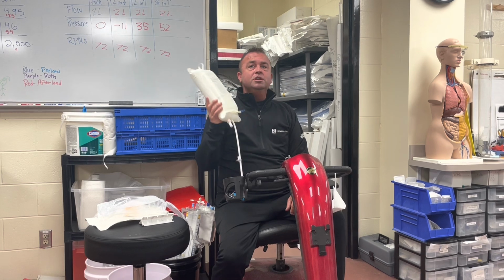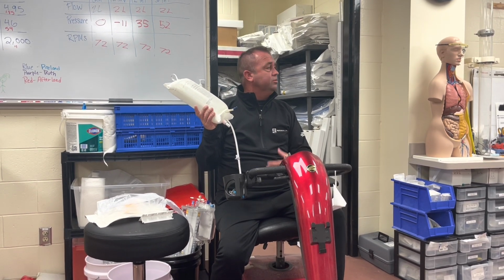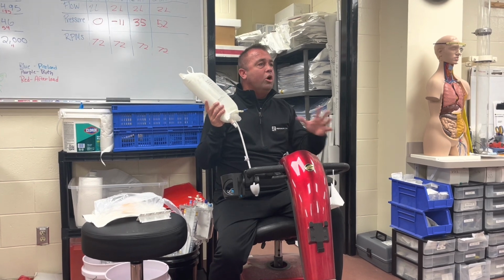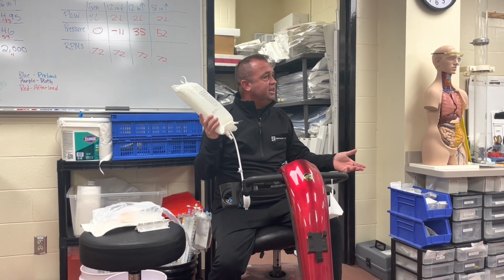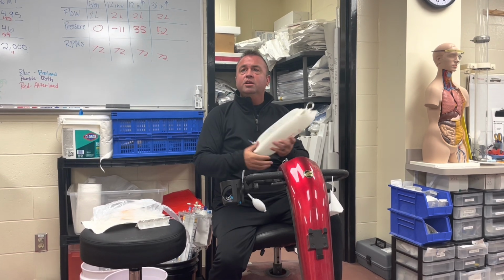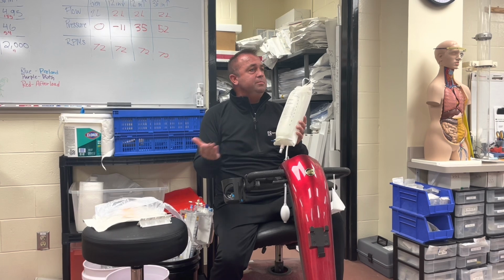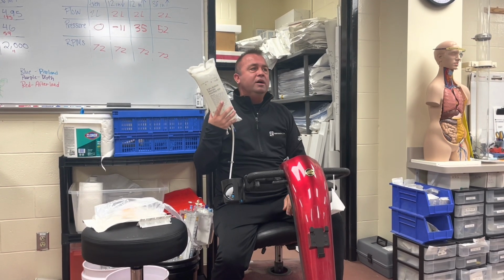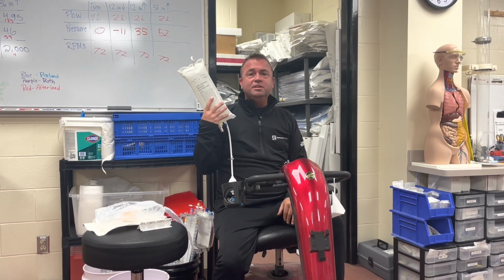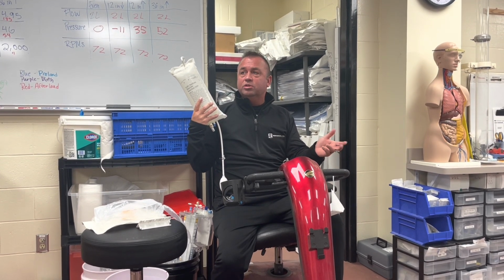A lot of times, perfusionists are responsible for setting up the pressure transducers. At the Heart Hospital in Lincoln, we did all of the pressure transducers, doubles, singles, triples, whatever the cases were for the next day. That way anesthesia could come in, grab what they need, go take them to the patient, put in lines, or the cases in between to make things efficient, we would set these up and get them ready. Is it a hassle? Yeah. Is it tedious? Yeah. Sometimes you have respiratory therapy or anesthesia assistants that do it or things like that.